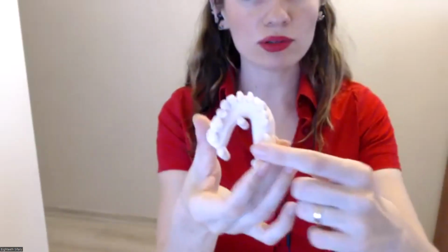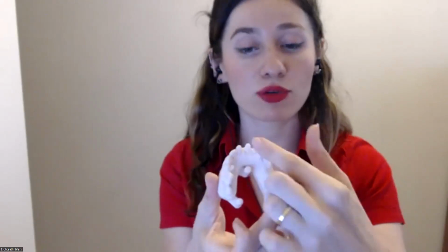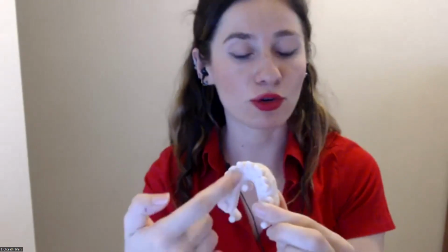During the scanning, we have a scanning protocol. We need to follow it, or the doctor needs to follow it. It would be better if we show it after installation. So basically, these are the areas for chewing. We call it the occlusal area, the bigger surfaces. We are going to start scanning from the bigger surfaces, and then the inside of the mouth, which we call the lingual or palatal surfaces.